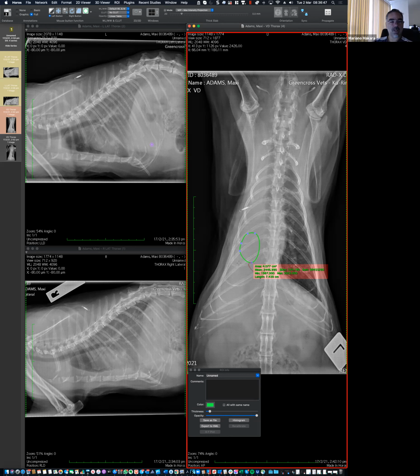Okay, so if you have a mass growing in that bronchus itself, and it's not only bleeding, but it's also obstructing the airway, you're going to reabsorb all that gas. Makes sense? There's no more gas exchange, and then that air is going to be reabsorbed. And based on the localization that we're assuming, up in the airway, then you can explain this unilateral distribution.